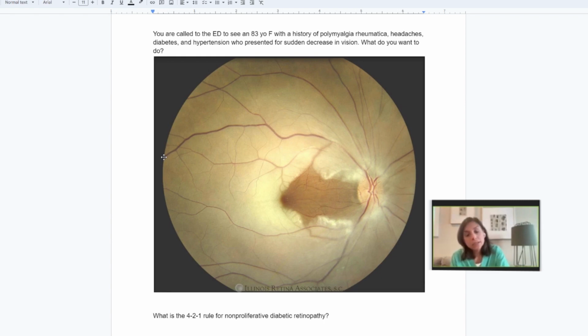And another thing to keep in mind is you wouldn't see a cherry red spot if you have an ophthalmic artery occlusion, because at that point your choroid is not going to be irrigated either. So you wouldn't see that orange hue that you typically see in CRAOs on the fovea. So if I'm understanding you correctly, you're saying the cherry red spot or this nice darker area is actually not changed. This is the normal appearance. We're just seeing the choroid, but this paleness out here is the change. It's from the ischemia and edema, making it pallorous, but this is normal appearance. Correct.